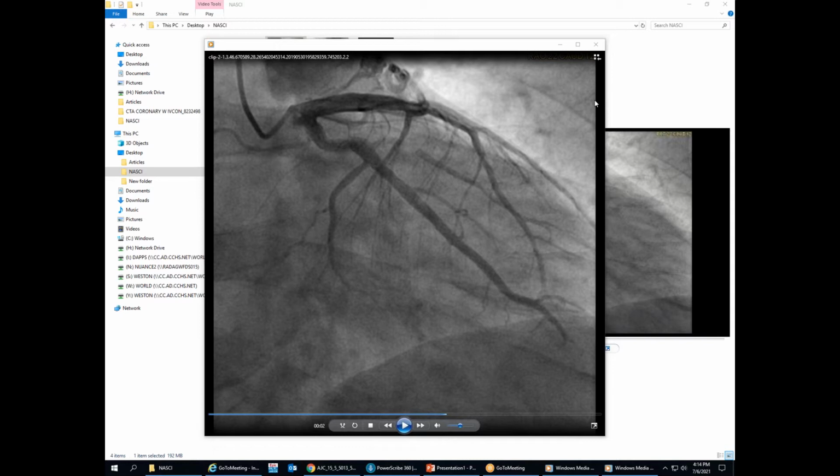What I've noticed, and I have had these conversations with other people, is that anytime we have a dilated cardiomyopathy, we tend to visually see non-compaction morphology as part of the imaging manifestation of it. The thinning of that myocardium, or it's not really thinning, but that stretching of the myocardium just makes that much more apparent.